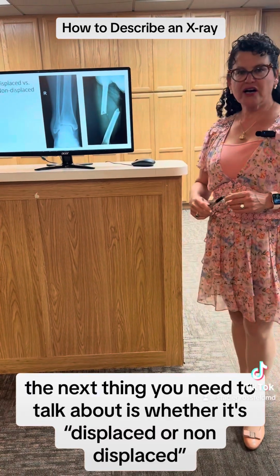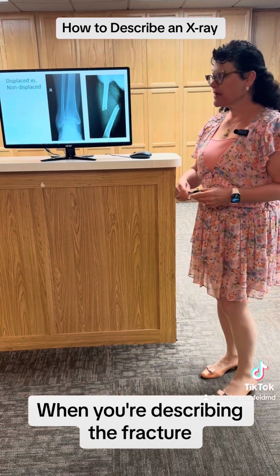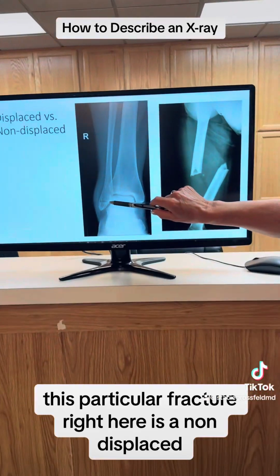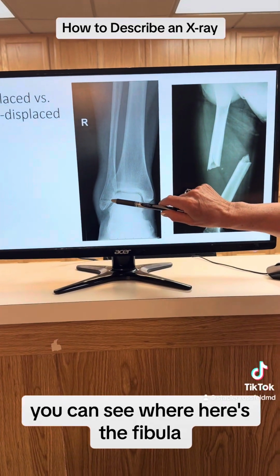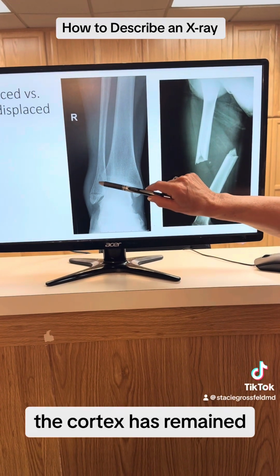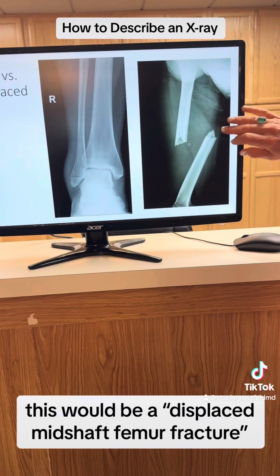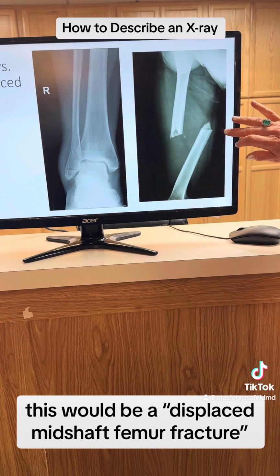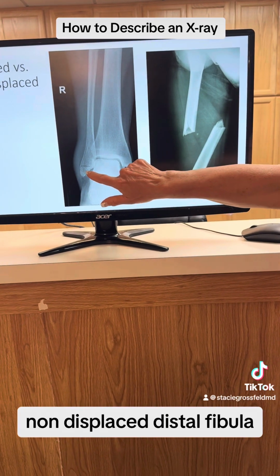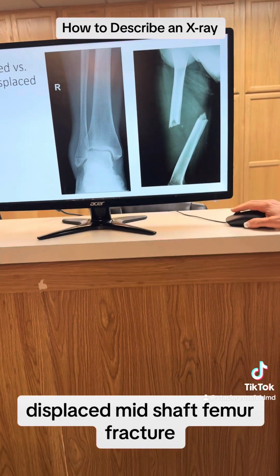The next thing you need to talk about is whether it's displaced or non-displaced when you're describing the fracture. This particular fracture right here is non-displaced. You can see where here's the fibula, the fracture line goes completely through here. The cortex has remained. There's no sign of any displacement. This would be a displaced midshaft femur fracture. Non-displaced distal fibula, displaced midshaft femur fracture.